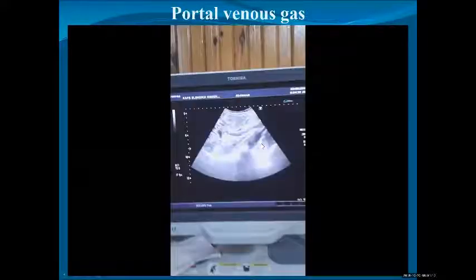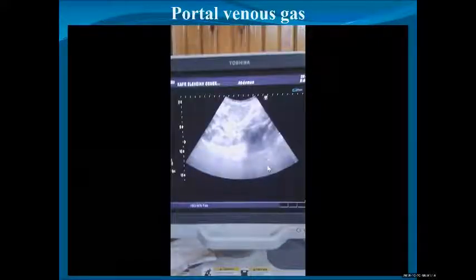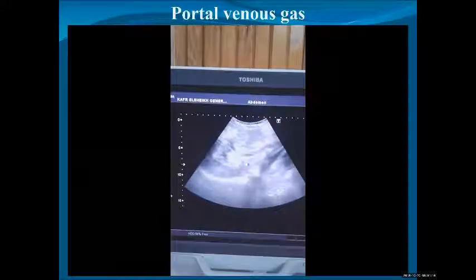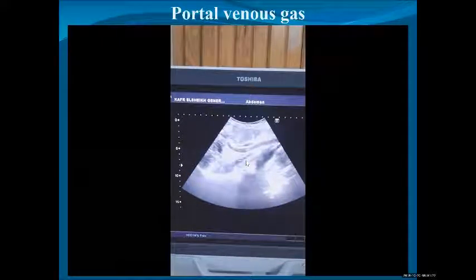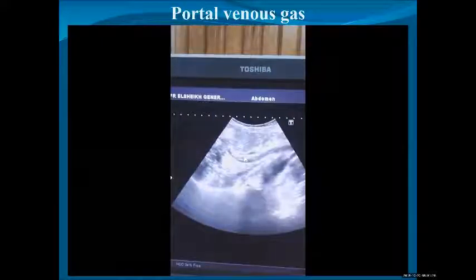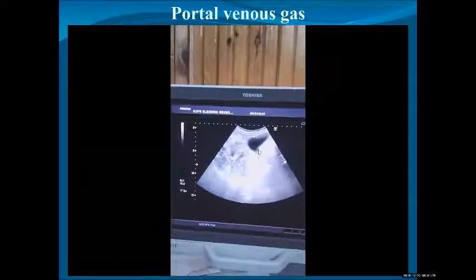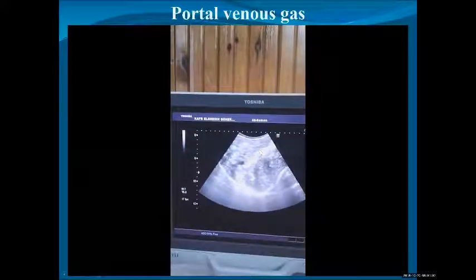you'll see that there is a very black area of the bladder, which means the contrast is not very high. But it looks very high contrast because they are picturing from one screen to another, and there is reflection. So this is not a good contrast. You have to drop the contrast if the picture is like this. You can see that area become white, the bladder appeared. Mostly this is a good contrast because the bladder looks very black. But again, there is shadowing, like contrast, because they are picturing from one screen to another.